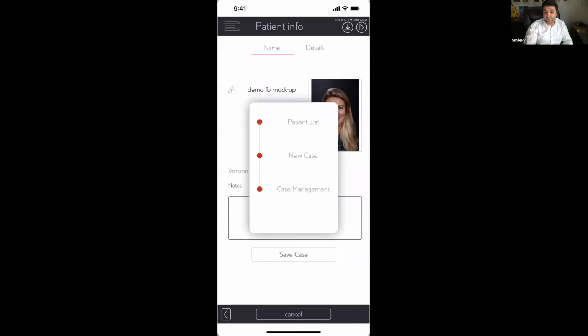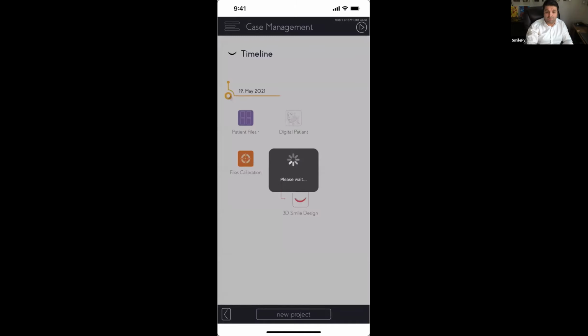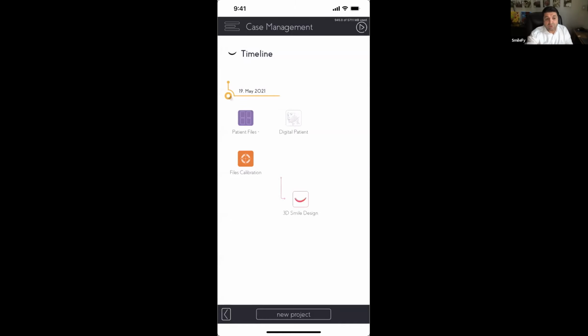So that was the case. 19-20 minutes with all the explanations, right? Usually, I did a recording, and it took me 8 minutes. Of course, you don't need to rush.